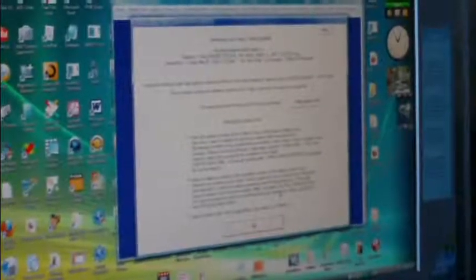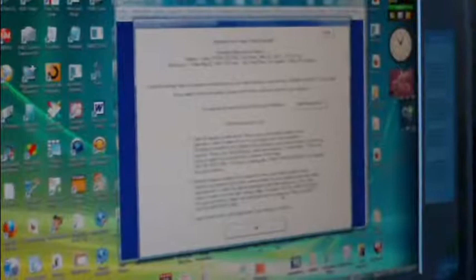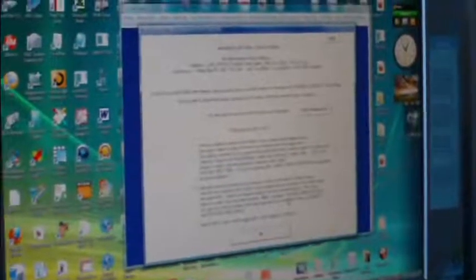This is also the choice that you would make if you had been working for some time, some weeks or so, with that data set using this computer at the Internet Data Storage location, and you decided to go offline for a while. That is, to temporarily disconnect from Internet Data Storage and simply work this computer in standalone operation, adding data to it.